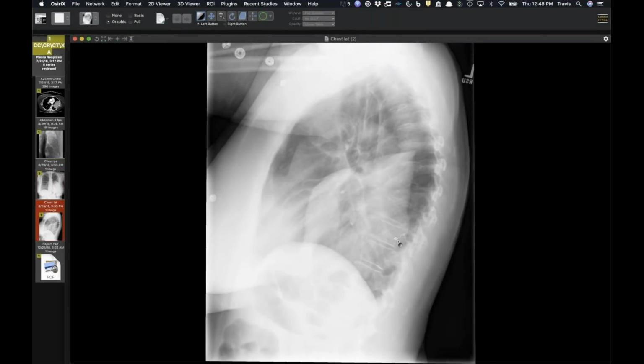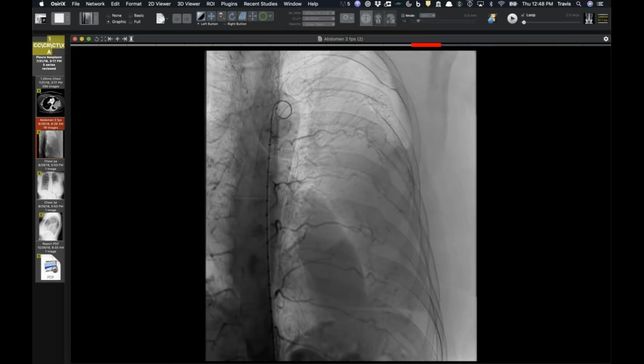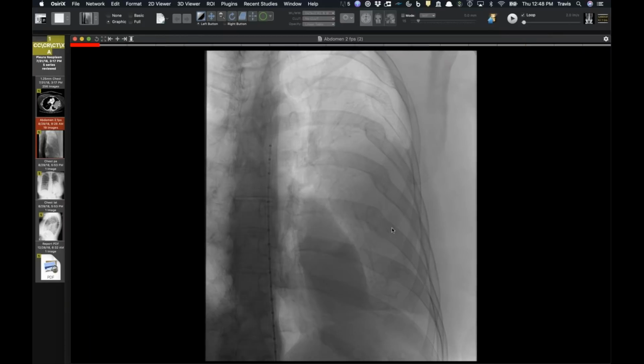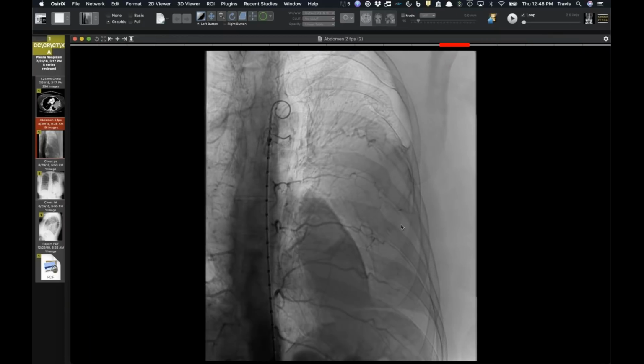And you can see there's actually a little coil here that's related to this. You can see the location here. It looks like it's in the fissure because you've got a triangular termination of it superiorly. So this is actually a coil embolization that was done for this. And this is the angiogram, and you can see a little bit of staining and a little bit of blush from an intercostal artery. So there is a little bit of intercostal flow to this huge mass.